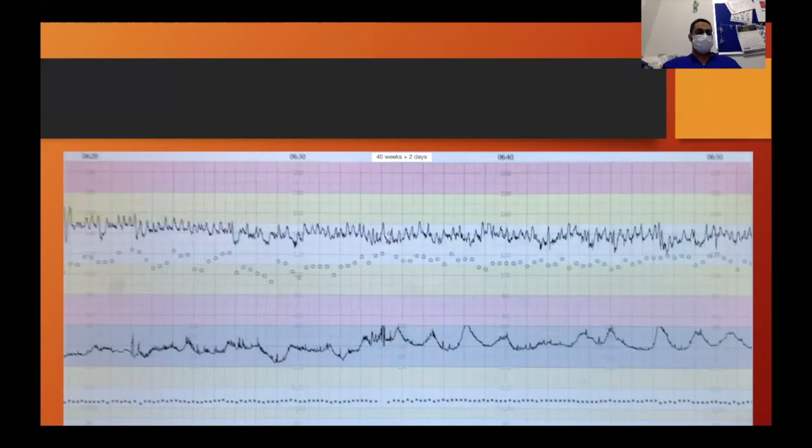What was the duration between the 6 centimetre and 8 centimetre VE? 3 hours. So as long as baby's coping, we don't need to do anything at all at the moment. We have an extra reassurance that's also telling us baby is centrally fine.